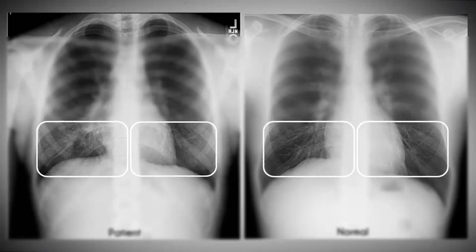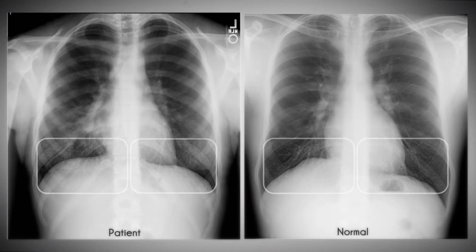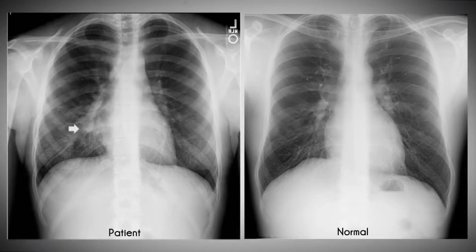Our patient's radiograph on the left displays a hazy opacity, but more importantly, the sharp contour or edge that should have been formed by air outlining the right atrium has been lost. The normal left heart border and normal right heart border are clearly visualized in the normal comparison example. But in the patient's radiograph, the sharp margin of the right atrium, which forms the right heart border, is lost or silhouetted out. A classic positive silhouette sign.